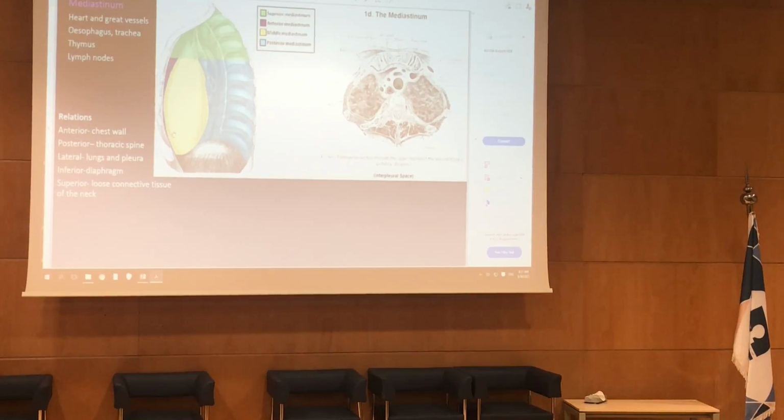The middle mediastinum mainly contains the heart and, of course, the pericardial sac, the remaining vessels, and the posterior mediastinum is the retrocardiac space. Okay, it's another important space to make sure that it's clear. So it contains the retrocardiac space and the remaining thoracic vertebra.